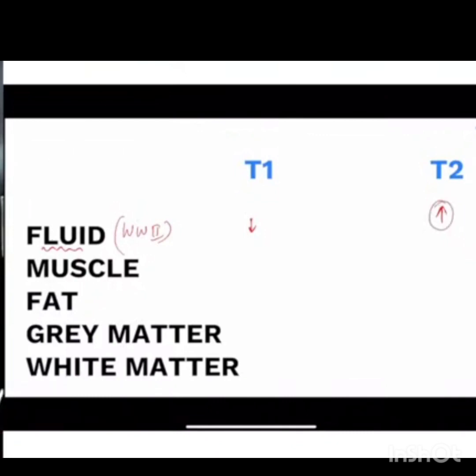What about muscle or any soft tissue for that matter? That is going to be a reference usually. Remember, we take soft tissue as the reference, muscle as the reference, and then we'll say that something is white compared to it, something is dark compared to it. So can I say everywhere that this is isointense? Isointense means intermediate. This is our reference that we'll be comparing white and black with. Depending on the organ that we are reading the MRI for, we will have that. I'll make my own stuff, but right now let's just do this MR sequence. So this is isointense.